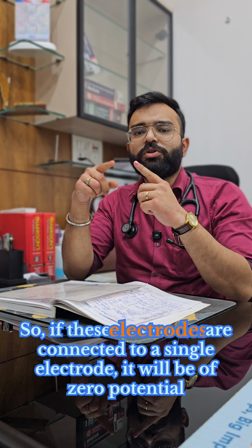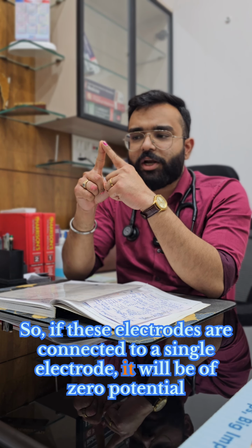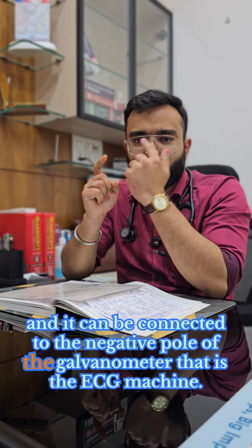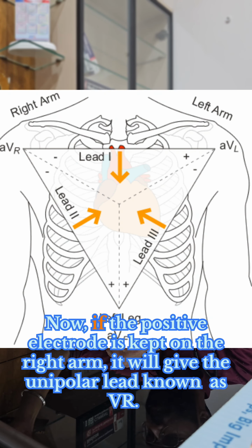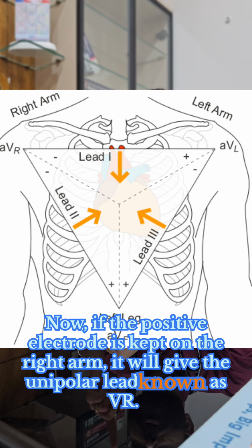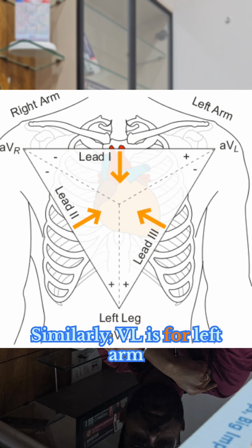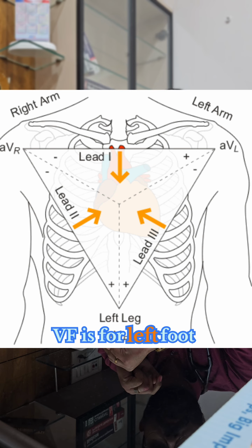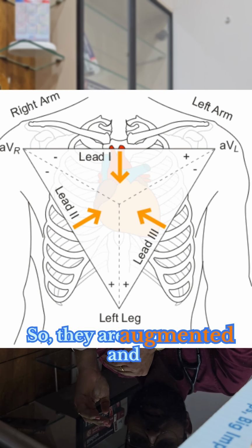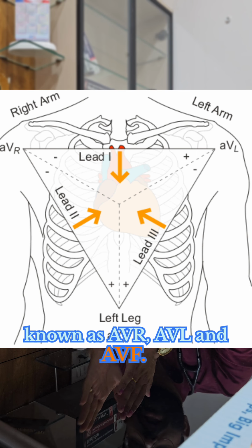So if these electrodes are connected to a single electrode, it will be of zero potential and it can be connected to the negative pole of the galvanometer, that is the ECG machine. Now if the positive electrode is kept on right arm, it will give a unipolar lead known as VR. Similarly, VL is for left arm and VF is for left foot. But these show very small deflection. So they are augmented and known as AVR, AVL and AVF.